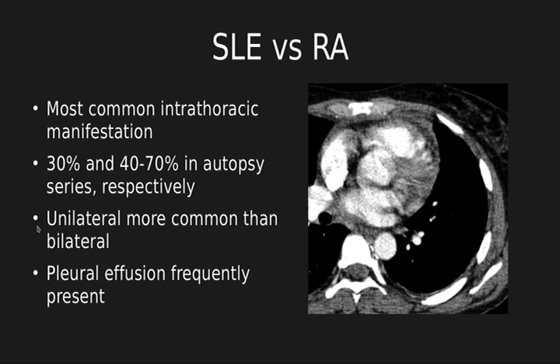It is more common to see the pleural thickening unilateral than bilateral. And the pleural effusion is frequently present.